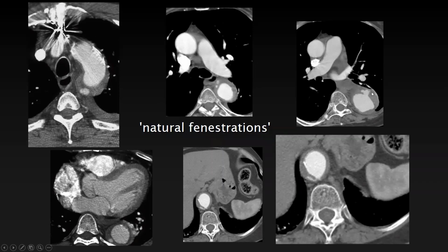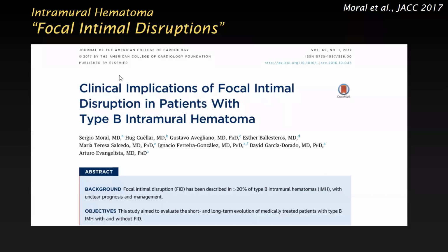And then this one is a little bit larger. So some of those lesions can be a little bit larger, and once they are larger than 3 millimeters, these little ulcers or defects have a more ominous prognosis than just these little puddles. These little puddles you will see all the time, and you would have to expect them if you have a good enough CT scan.